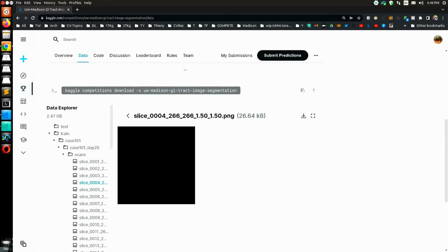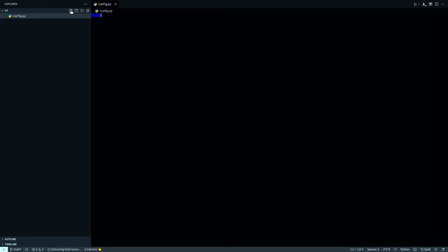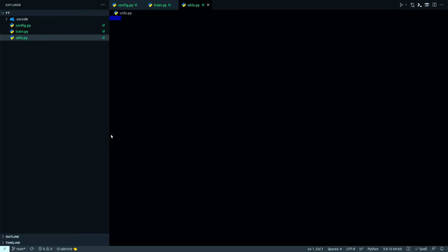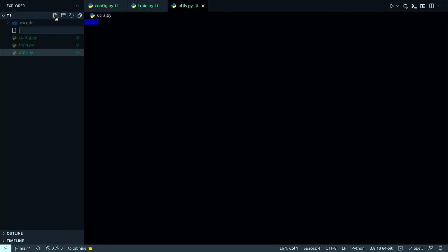I have downloaded this data set on my local machine, so I'm starting the project in my VS Code, and as usual with all my other projects, let's create the files first. And I also need a Jupyter notebook file, of course, UW.